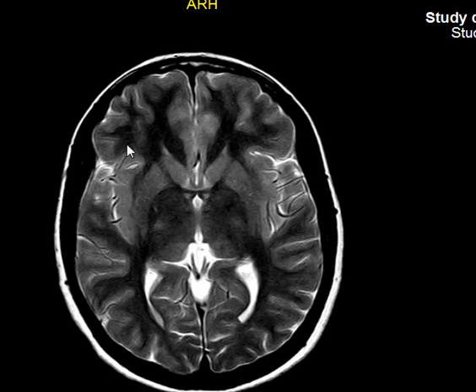This deep gray matter is called what? Insula. The insula does not like to be uncovered. It likes to be covered. So each cover we call it what? Operculum. Okay, you have frontal operculum, parietal operculum, and temporal operculum. You have three opercula covering the insula.